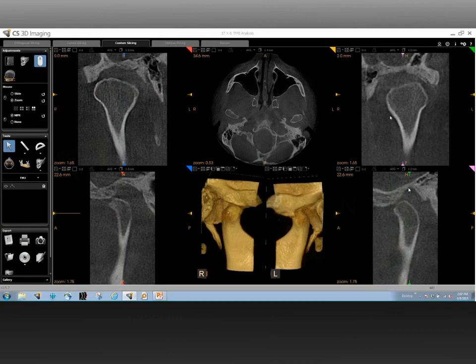And there you go. You see the first change over here. You notice some sort of flattening. In fact, you can see on the lateral side, on the superior head, there's actually quite a bit of loss of cortical bone there. And then as we go further lateral, you can see a remarkable indentation indicating possibly a very chronic degenerative osteoarthritic disease on that side.